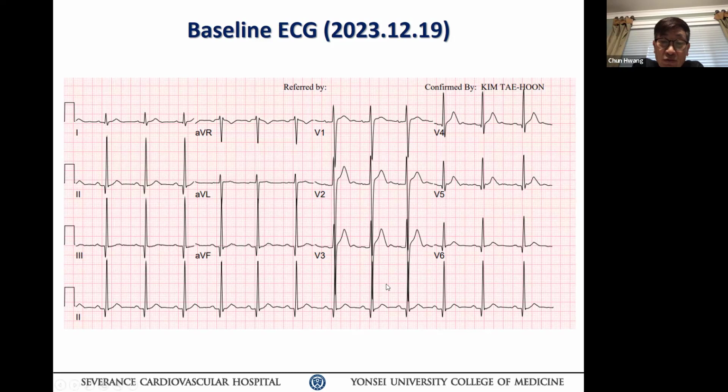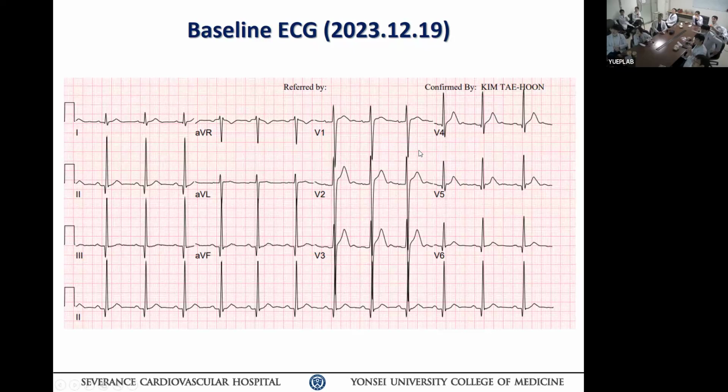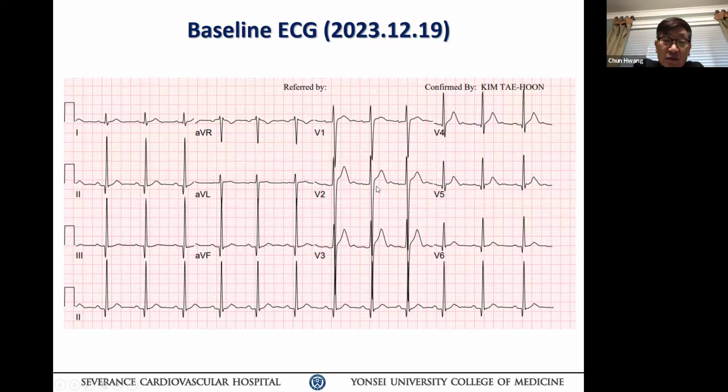You see. 무슨 웨이브야? Precordial 보세요. V2, V3, V4, V5. You see. Second wave 보이지? 이 환자들 U 웨이브가 굉장히 크네. 그죠? T 웨이브. 특히 V2 보세요. T 웨이브가 터미널 하자마자 second hump가 있고 그다음에 P 웨이브가 있지?